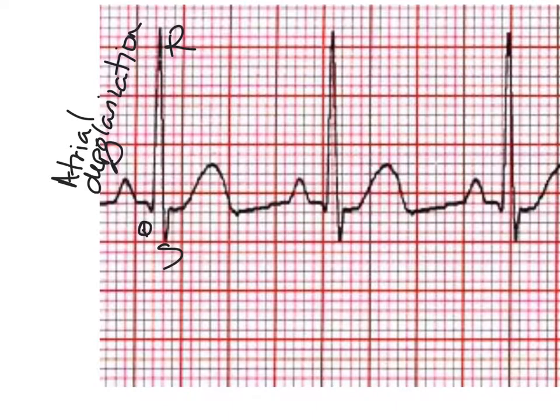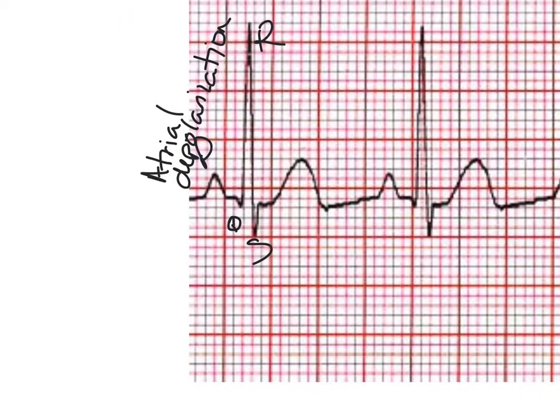What the QRS is going to tell us, I'm actually going to move this to the side. What the QRS is going to tell us is ventricular depolarization.